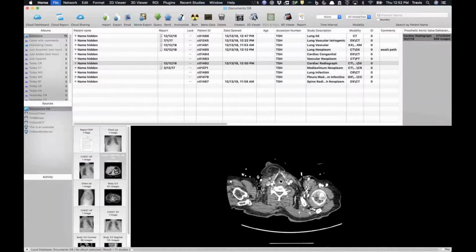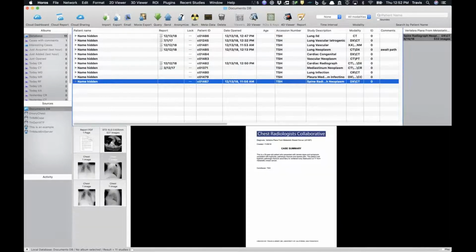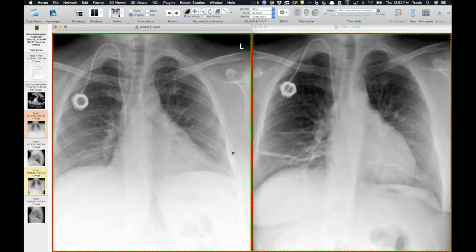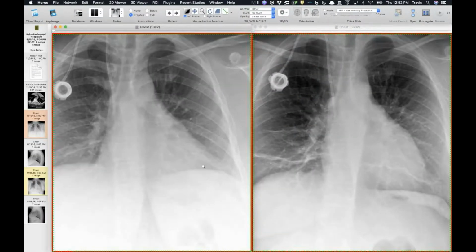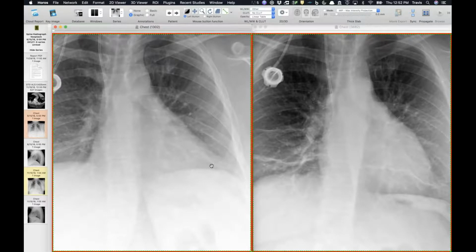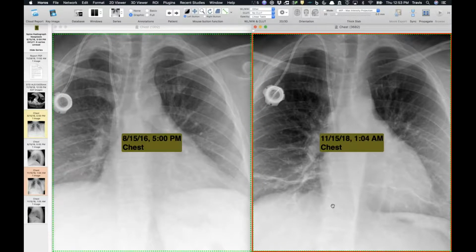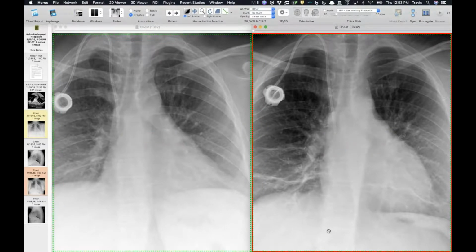Gosh, yeah. Okay, I'll show one more quick radiograph case, and then I'll let you finish up here. This is just a quick one. Again, I think it's always important to show little eye tests, because this one also shows the value of the lateral view. So this is a patient. You can see she's got a port catheter. She has breast cancer. We have 2016 and 2018, so I'll let you take a shot. Howard, I know in particular you like trying to see what you see on these.